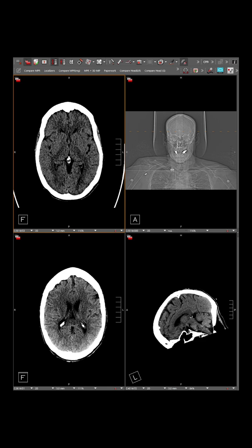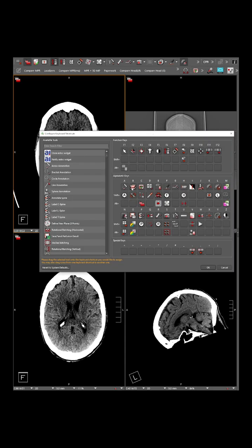That I think covers a lot of the most important tools. Let me think if there's anything else. We'll just bring up this and we'll just go through our hotkeys and make sure we've covered everything. Angle. Oh, then I think this is actually quite important.